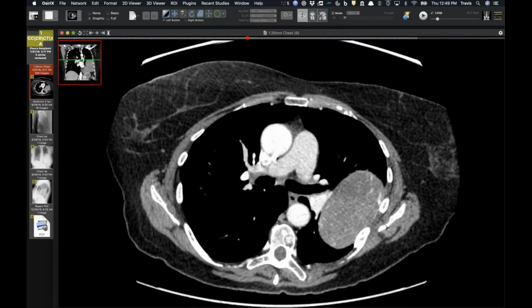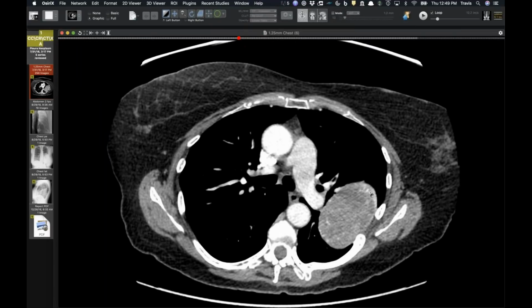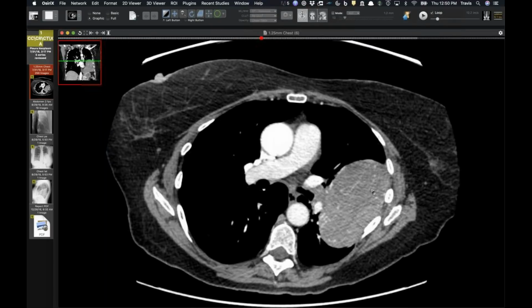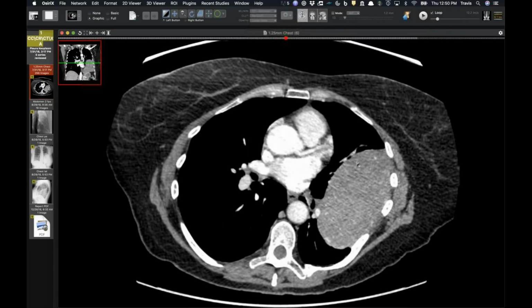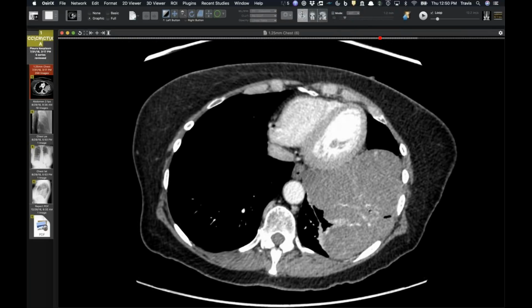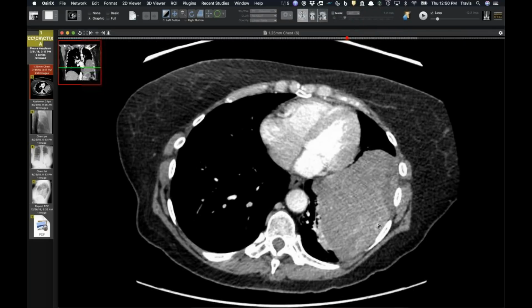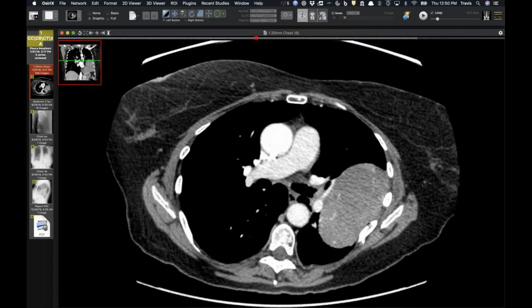Yeah, I just thought it was interesting that they were treating these intercostal vessels, since it arises from the visceral pleura, and often the stalk is, as David always likes to point out, somewhere from the lung parenchyma itself. But this clearly has a lot of vasculature from many different places.